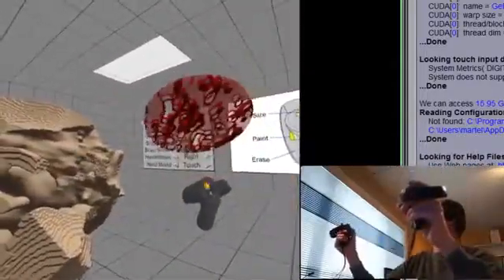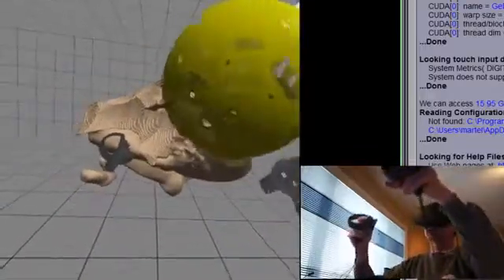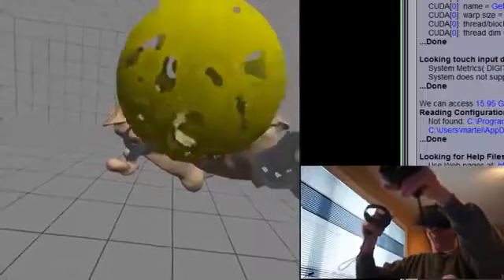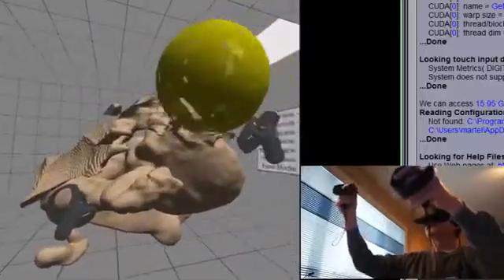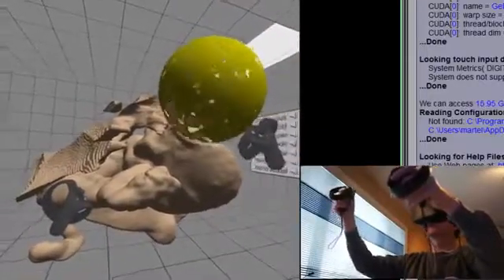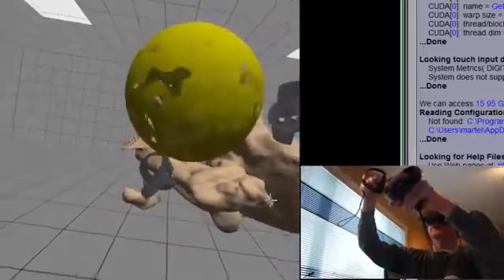If instead I go with my GLI edit, then I've got something much smoother. And I'm going to use it, but it's a little bit slower because I have to change the GLI values until it is under the threshold value.